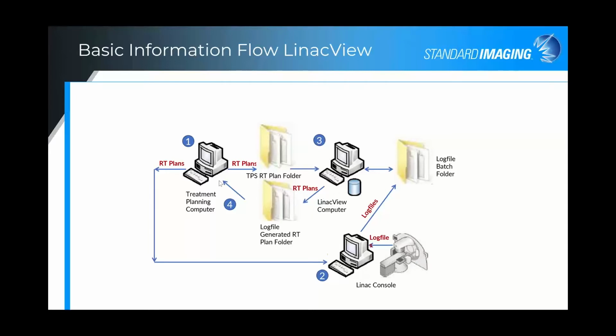When we first released auto RTPlan, it just auto exported all the plans, and as we listened to our customers, there was desire to have that be turned on or off, and some selection for how that is done. And so you can choose which patients you would like to auto export, and then of course you can go ahead and pick up those plans that are generated with each session and compute those in, say, back in your treatment planning computer, or using an independent dose calculation engine. So that is the complete workflow.